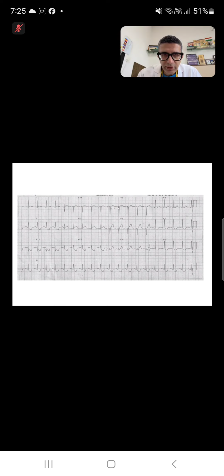Okay. The reason why I took you through all these things is just to show you that if you don't repeatedly practice writing down the ECG in all the 9 or 10 aspects of it, you will tend to miss a lot of things. So it has to become part of your character. It should go into your subconscious mind. The moment you see an ECG, you are looking at everything.